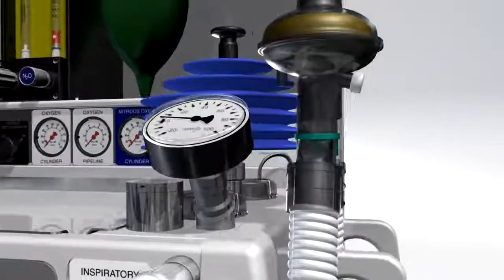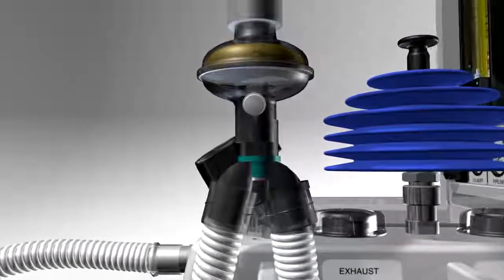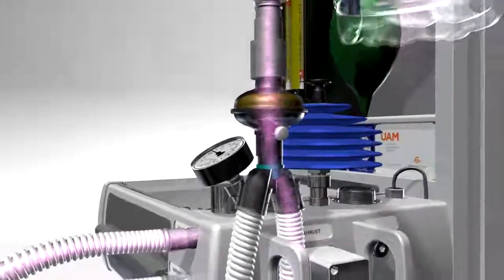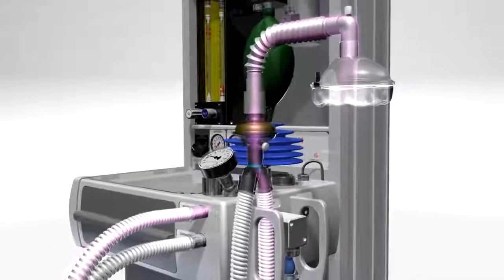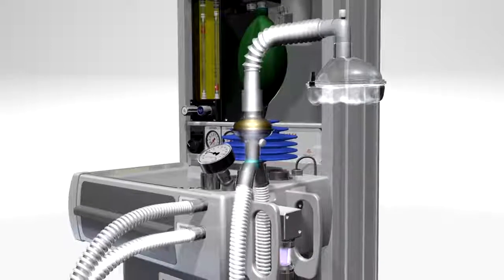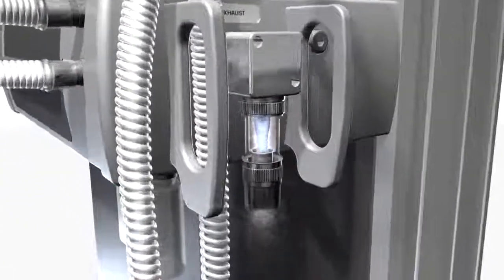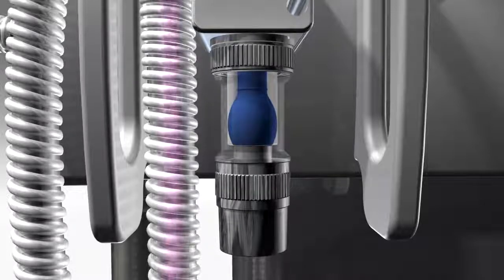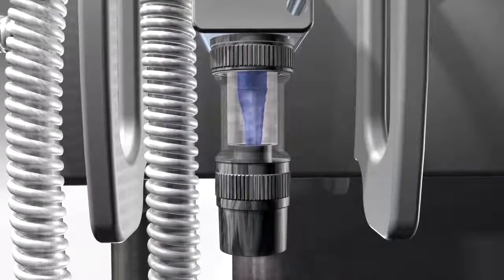The UAM uses a conventional Y-piece patient connection. The anesthetic gas flows to the patient through the Y-piece connected to a face mask, endotracheal tube, or LMA. The expiratory limb of the Y-piece channels gas to an inflating valve on the UAM that functions like an ambu valve. It uses a balloon made from long-lasting silicone, which closes during inspiration to direct gas into the lungs. During expiration, the balloon empties and opens the exit port, allowing exhaled breath to flow out through a final one-way valve to a scavenging device.